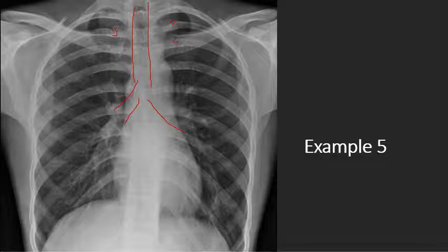The way I learned it was that if you can imagine, in your mind's eye, running your finger over a rib and feeling on that rib something that would hurt your finger, that's probably something that you need to develop further. Looking at the lung fields and everything else, I don't see any pneumothorax.